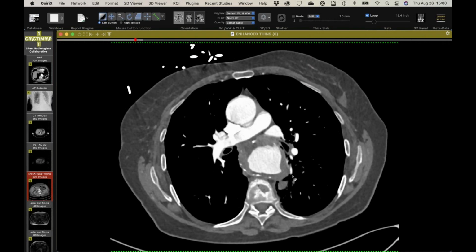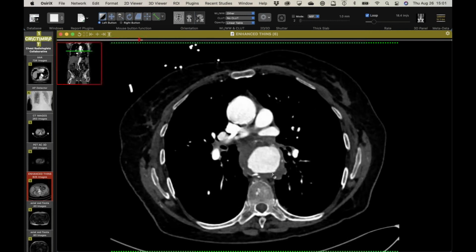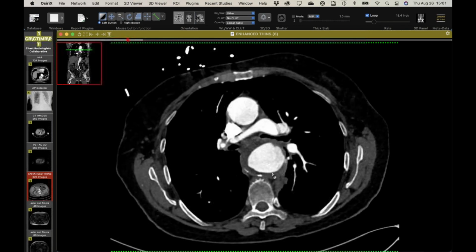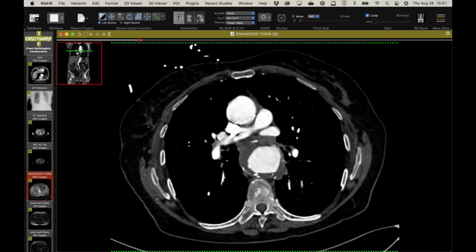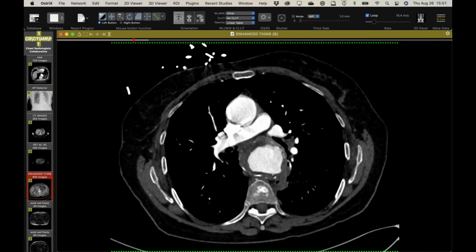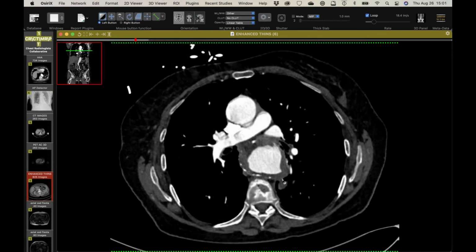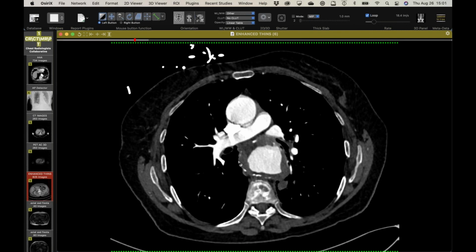I knew about the impending rupture sign on non-contrast, the hyperdense crescent sign. But this is a different one for contrast, which I recently learned about. Well, that's cool. Thanks for sharing that. Keep an eye out for that. Yeah, these aortic cases, of course, I saw these two on the same day, and they can take a lot of time, or at least cause a lot of confusion. They can be really challenging, especially when you have a lot of atherosclerotic disease, sorting out what's thrombus, what's plaque.